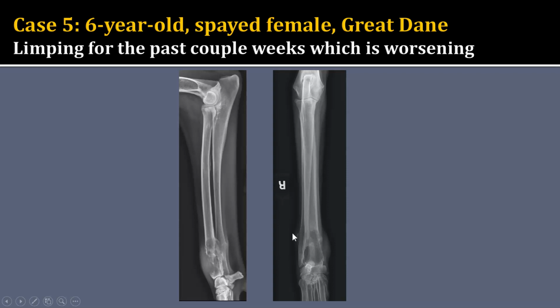Now, this lesion over here in the ulna, this is a very benign lesion, very non-aggressive lesion. It has a very distinct transition zone. It is a very smoothly marginated piece of bone. And this is actually a benign bone tumor called an osteochondroma.